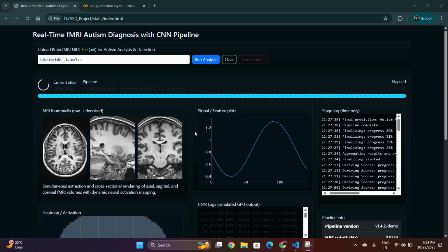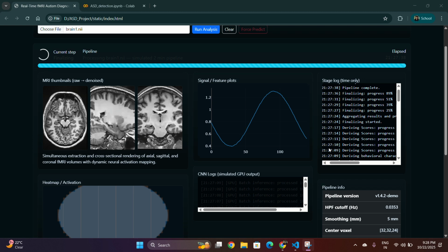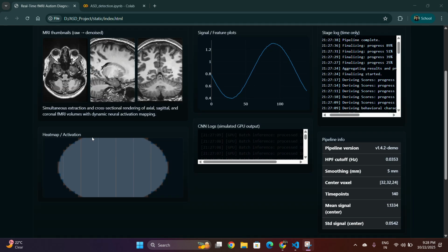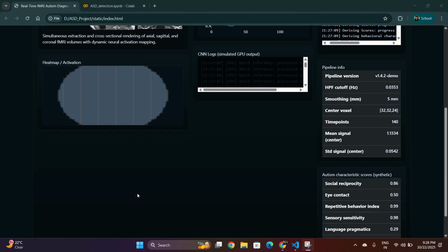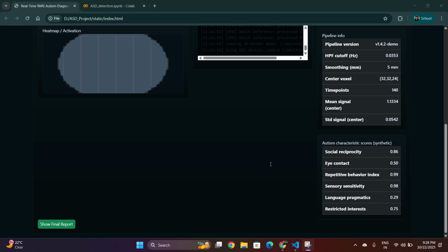Now, as you can see further, we had these three images, and after normalization the pipeline extracted the meaningful brain features and the multigradient plots that you can see here. The heat map was used to identify the core features and for additional binary prediction. And these are the logs of the CNN pipeline. These are some of the smoothing millimeters that we used here.